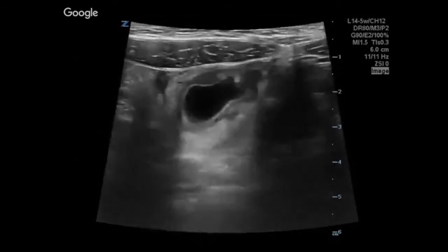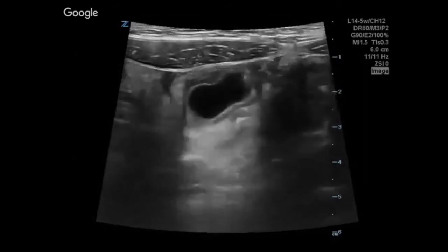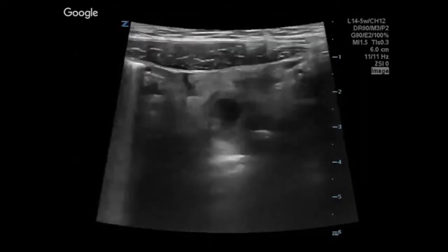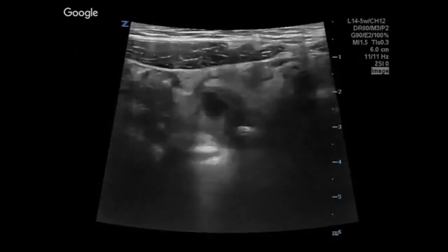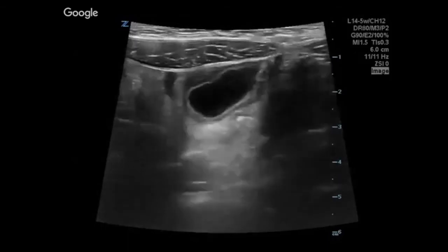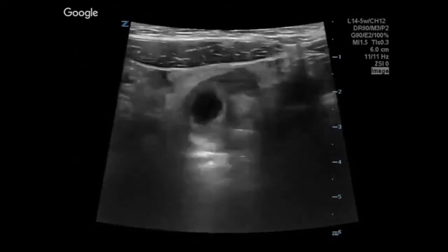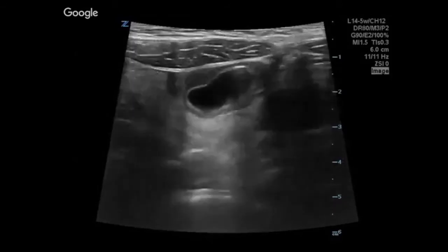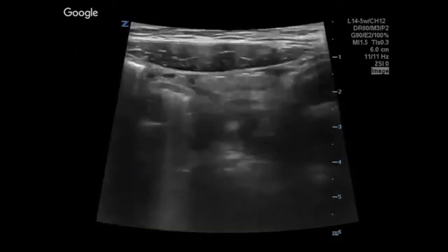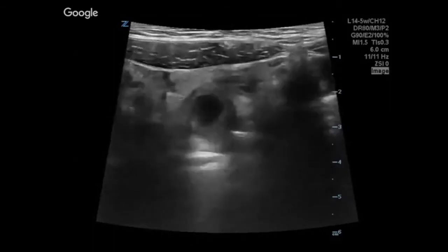No bowel motion. There is no peristalsis. And so the differential I noticed is some kind of a cystic structure. It was mesenteric or Meckel, so that was one of our differential diagnoses. So then we sent him back for a comprehensive abdomen ultrasound. We think we see something that you haven't been able to see, so please redo your ultrasound.